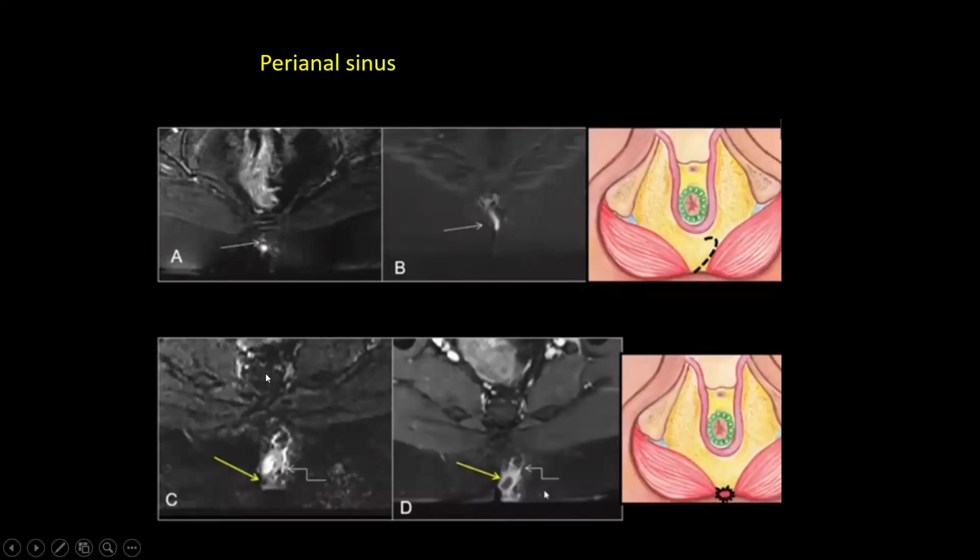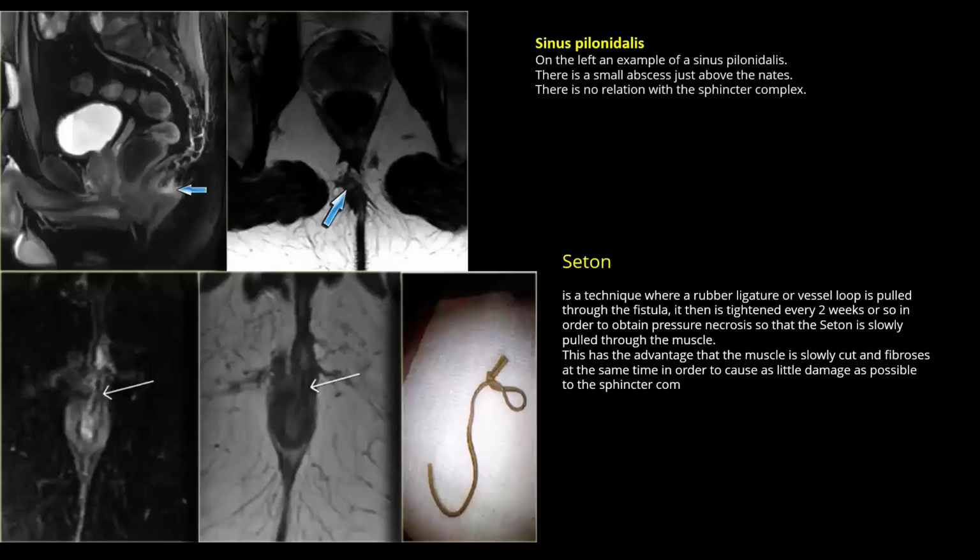However, in my experience, we are also having a thesis on this. We have seen that a lot of cases we just call perianal sinuses, when they are operated, actually they turn out to be fistula. So actually it becomes an issue when the tract is occluded. They do not have a very obvious internal opening. The internal opening is occluded. Then yes, you can miss at times.